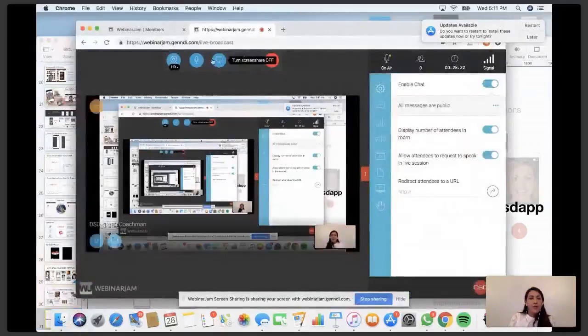Excellent. So I want to share with you how to create a smile simulation and how easy and quick it could be. Okay, so let's go, and I'm going to share my screen with you. Hold up, I'm going to log in.